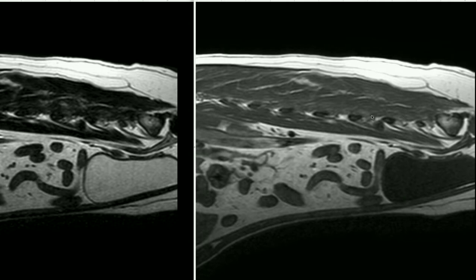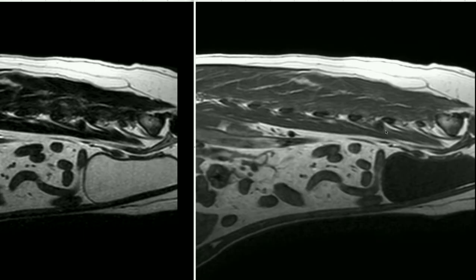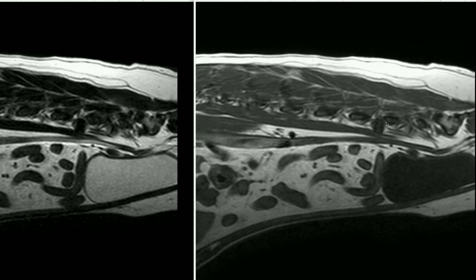So we can see on the parasagittal images here that we have the normal lumbar nerves which run within the psoas muscles, and we can see that adjacent to the nerves themselves we normally would see this fat. So this parasagittal image can be quite nice when we have pathology within the nerve roots of the lumbar nerves running through the psoas. Sometimes we'll see swelling or attenuation of this normal fat signal. In this particular case, we can see the nerve root itself, and we have this possible impingement between this tissue and the transverse process of L5.